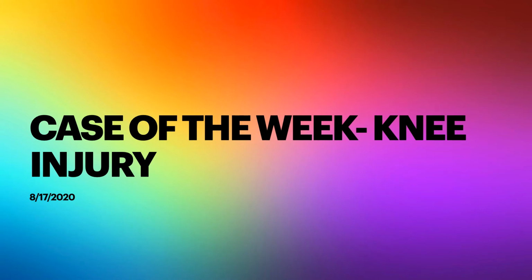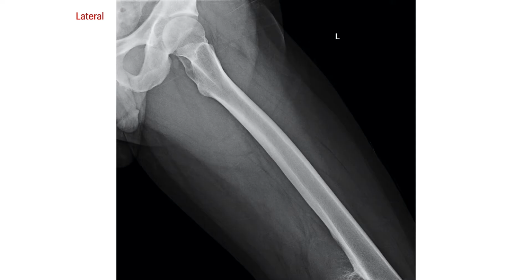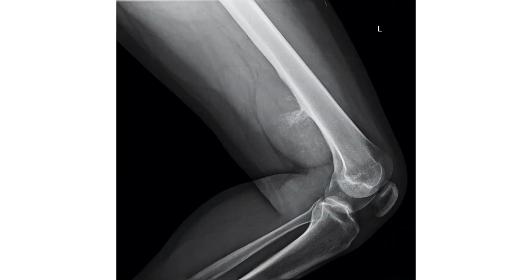So this is a young patient who presented to the sports medicine clinic with a complaint of knee injury. So we have some femur radiographs here. We have AP radiographs of the proximal and distal femur, and we can see that there is some mineralization within what looks like it's in the femur on the AP here and kind of extending into the lateral soft tissues there. Here on the lateral views, if we focus in on the distal femur, we can see that it's actually not within the bone itself, but it's actually posterior.